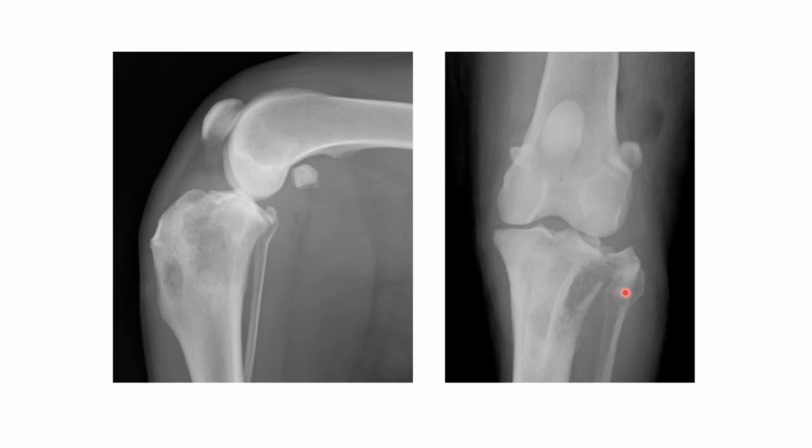And as a result of that, we've got this single, large, roughly triangular bone fragment, which is slightly displaced proximally and laterally. There are a few other changes as well. So there's certainly an increase in opacity of this stifle joint and cranial displacement of the fat pad and associated soft tissue swelling. So the soft tissues around the stifle joint look larger than they should look.